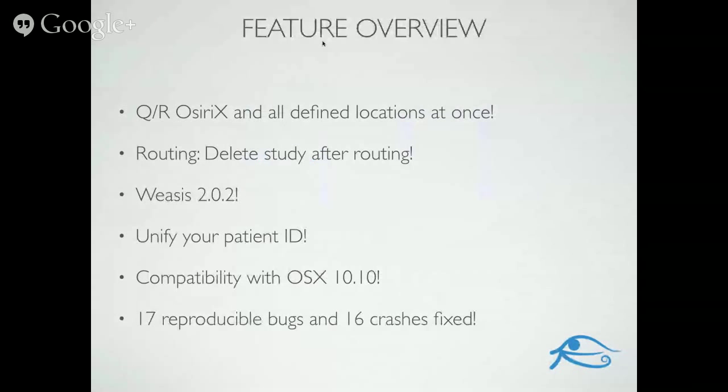So, some great features in OsiriX 6.0. Going to roll through them real quickly and help you understand what they are, what they look like. The first feature that's truly beneficial to individuals managing images in their enterprise environment: query retrieve of multiple defined locations in the OsiriX application at once, which is actually really powerful.